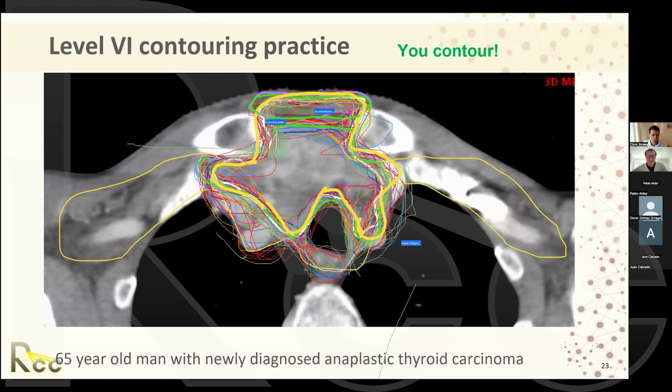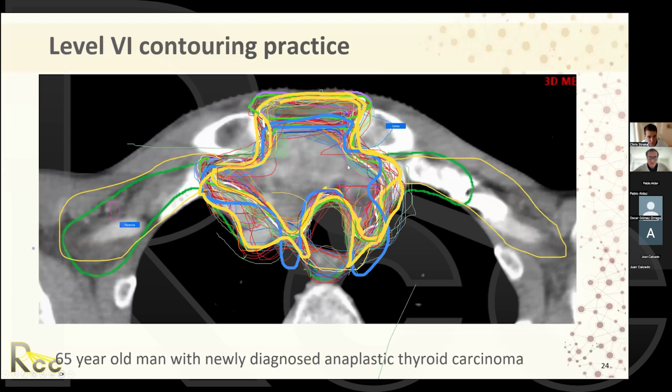Okay, perfect. Well, thank you everyone for your responses. I think this is great. Gives us some great talking points. So I think they're going to stay. I'm going to go to the next slide, which has my contour on it, but I think they'll all stay. Yes. So my contour is in green. You can't really see it clearly.